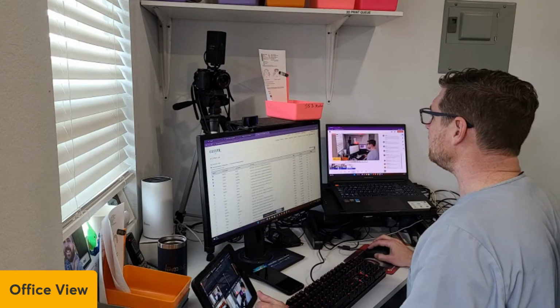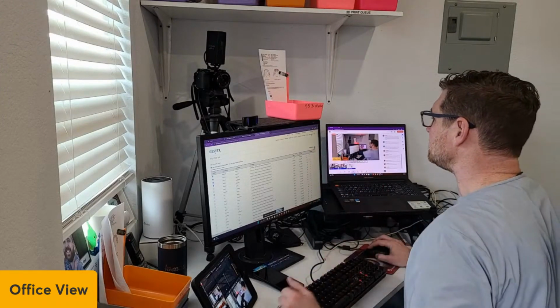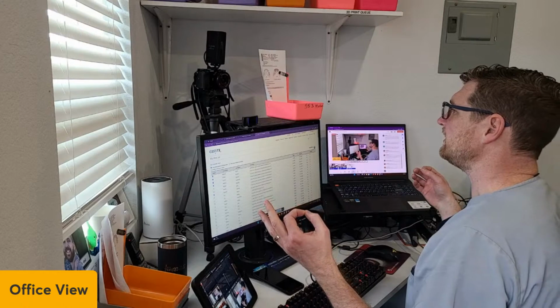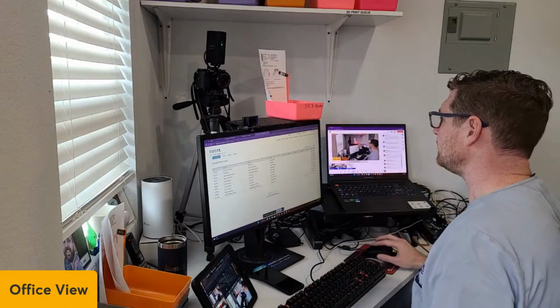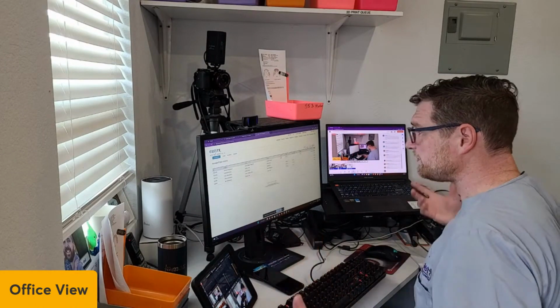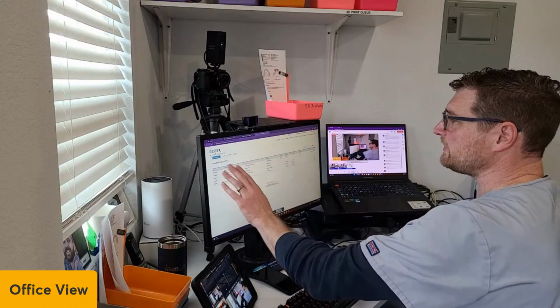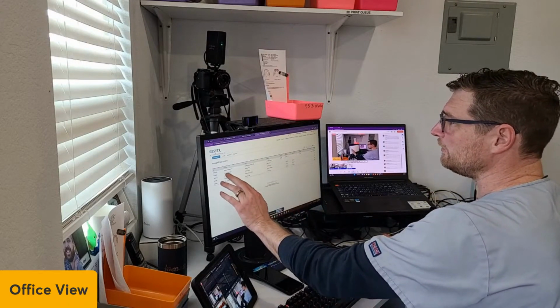And I'm actually going to click up here in the right hand corner. It says prescriptions. I know y'all can't see that, but it says prescriptions, and you can actually search by prescription. So I have my case pan number here, and that's how I usually like to search for these. It's just easier than typing in a name. I'm a terrible speller, so I like to do the case pan number. So it pulls up everything that has this case pan number or used to. So these are the cases that used to be in there.